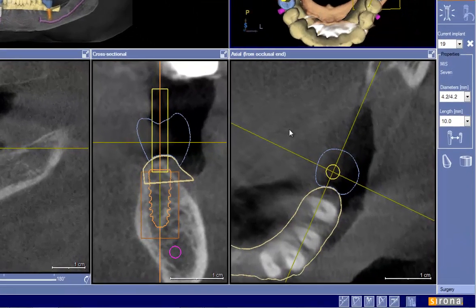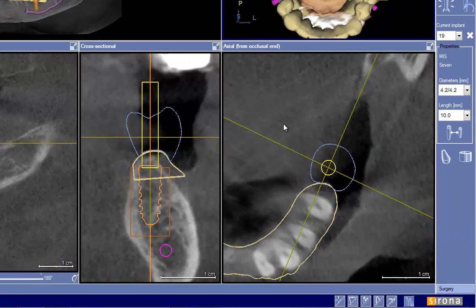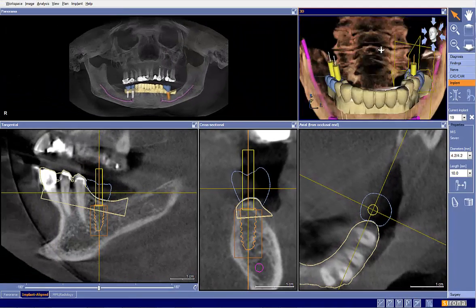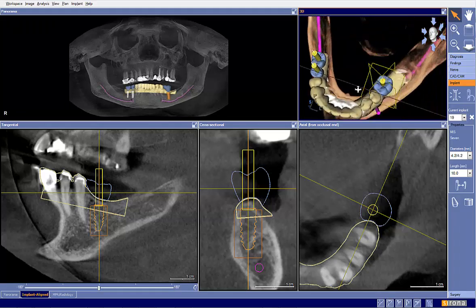Okay, we have a case submitted here for 3 implants. We'd like to take a look at these. This also is from a gentleman who was just recently at our seminar workshop, and let's take a look. So I've gone ahead and duplicated, sliced and locked in my window here so I can work.